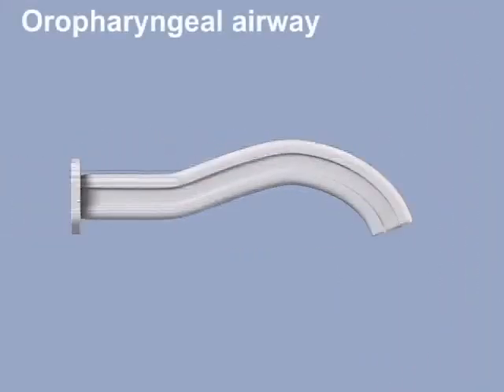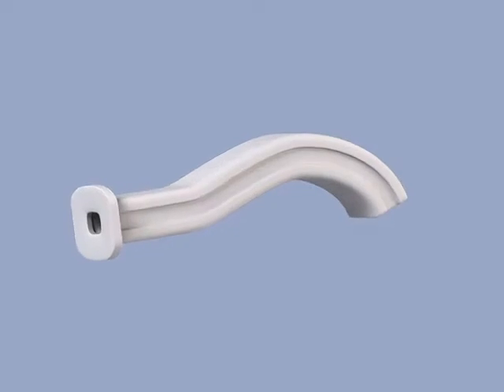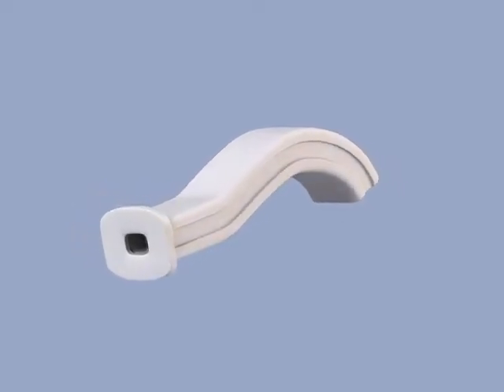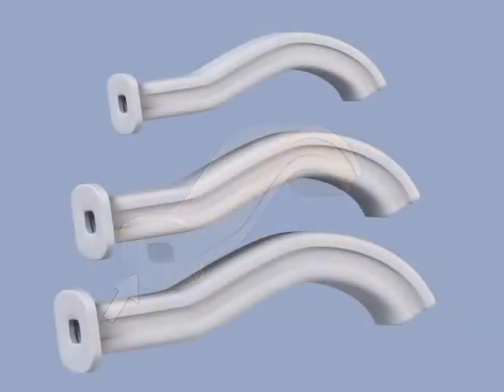Oral airways are firm, hollow tubes that, when inserted, provide a conduit between the mouth and the glottis. These devices have flanges on the proximal ends that prevent inward migration. Oral airways come in a variety of sizes. Correct size selection is covered later in this video.